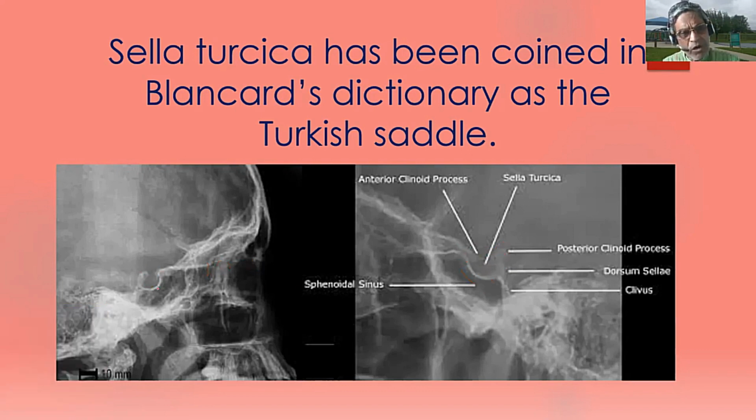See now here, this is the depth of sella. This is the length of sella. Just those two points: depth of sella and length of sella. You should know the normal values. The length of sella is about 10 to 15 millimeters. The depth of sella is about 8 to 10 millimeters. These are the points you are supposed to know when you are given an X-ray skull, lateral view. The chances are they can ask you about sella because you can't escape.